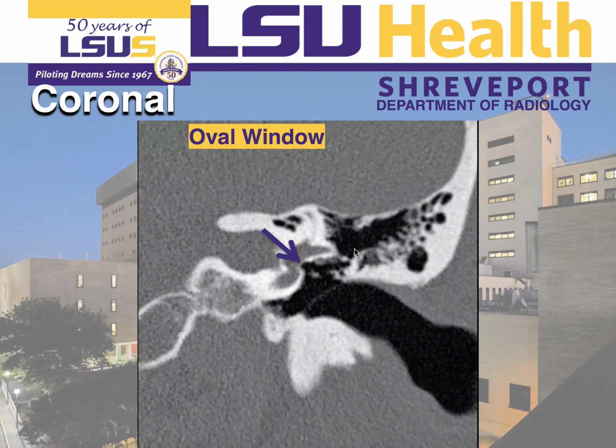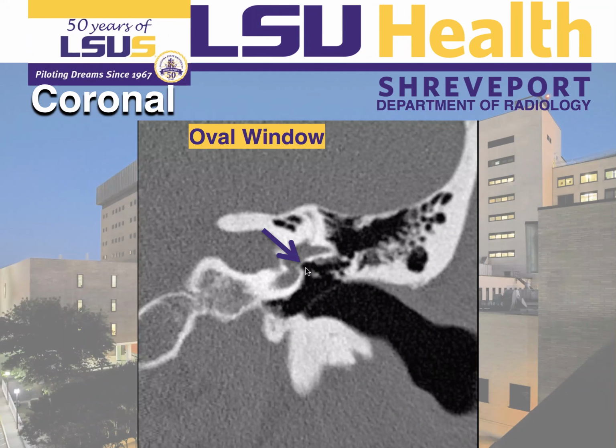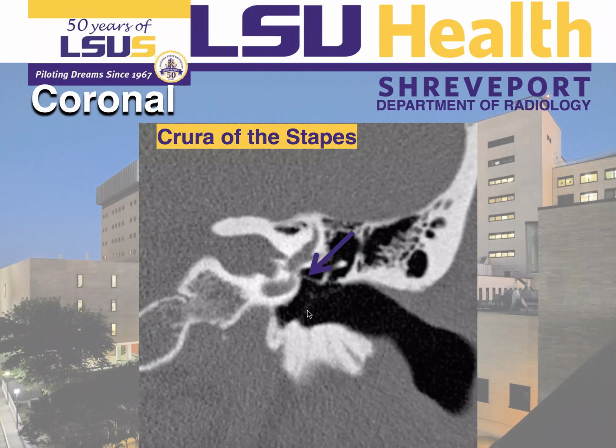I know that we have this axial approach, but I should talk about this coronal view, guys. Here we have the scutum. If we go posterior, we're going to see this oval window, the lateral semicircular canal, the tympanic membrane. Here we can see the tegmen tympani.